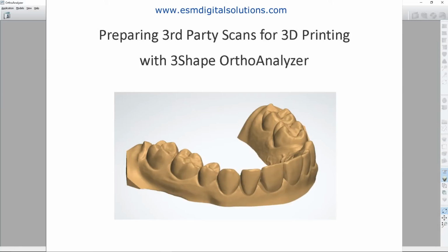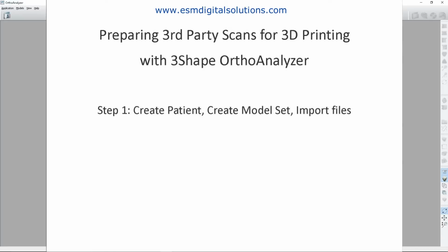In this ESM training video, I'd like to take you through the process of preparing third-party scans for 3D printing with 3Shape OrthoAnalyzer. There are 5 main steps to this process. The first step is to create the patient, create a model set and import the files so that we get them into the OrthoAnalyzer database.